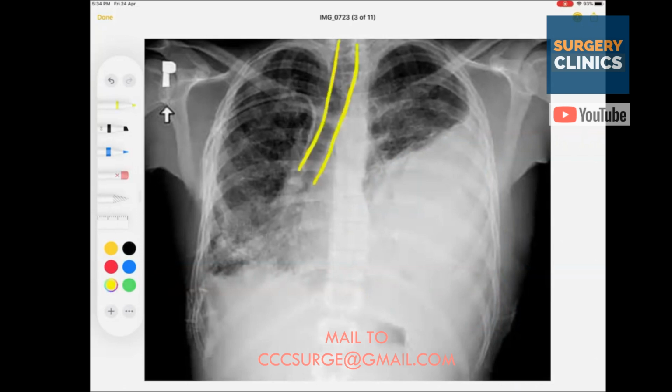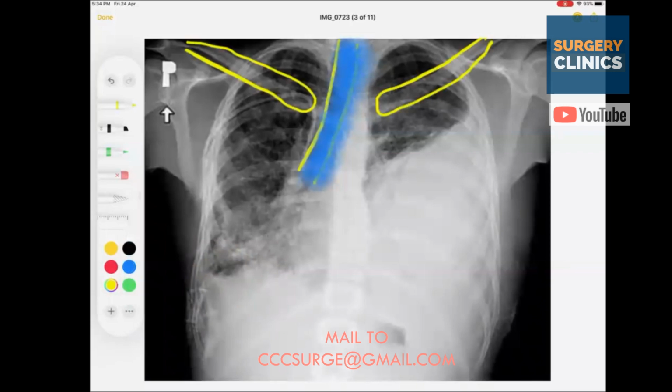What is the thing that I forgot? Yes, this tube. What is this tube that I'm trying to show you? Is something that is called as the trachea. Is the trachea central in location? Let me see then. Well. Clavicle, this clavicle. Can you appreciate that this pipe or the trachea very beautifully is more on the right side than the left side?